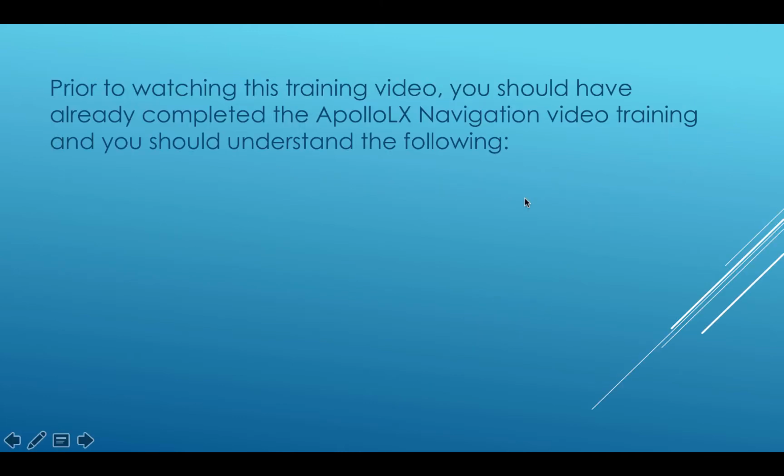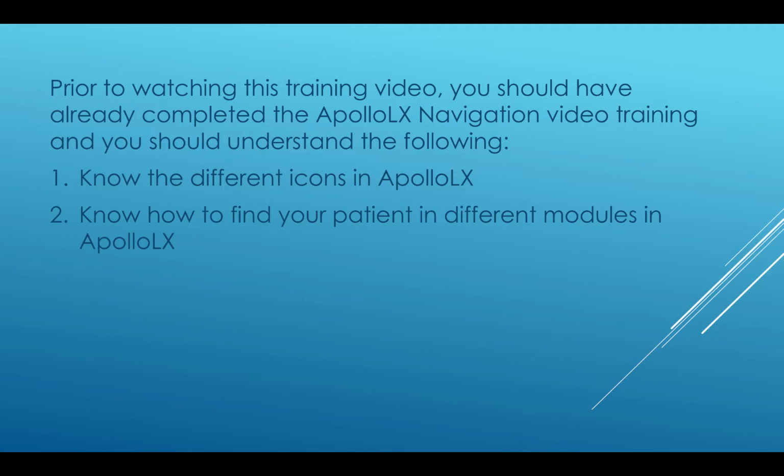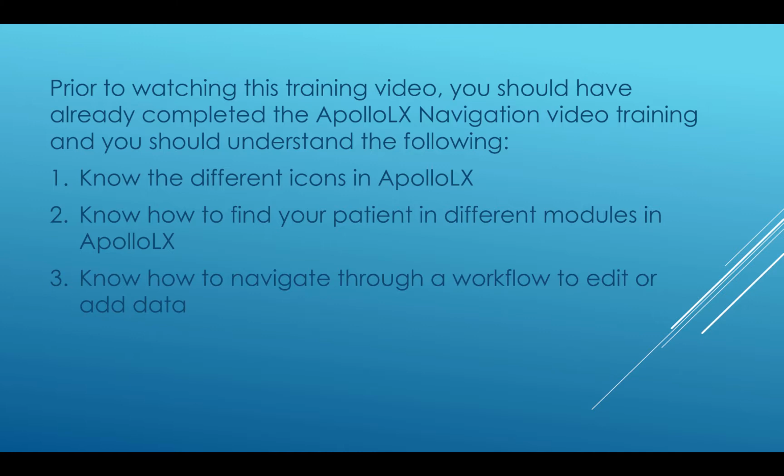Prior to watching this training video, you should have already completed the Apollo LX navigation video training, and you should understand the following. 1. Know the different icons in Apollo LX. 2. Know how to find your patient in different modules in Apollo LX. 3. Know how to navigate through a workflow to edit or add data.